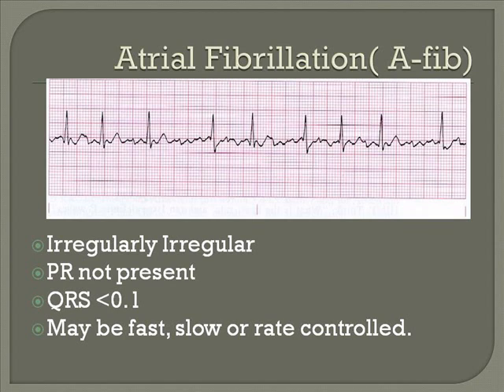You can see a lot of underlying chaos in between the beats. There's no steady isoelectric line to go by. There's nothing flat to give us a base to work from. It's all just a bunch of chaos in between the beats. So when we measure this one out, we count the beats. There are 9 of them. This still has a narrow QRS.